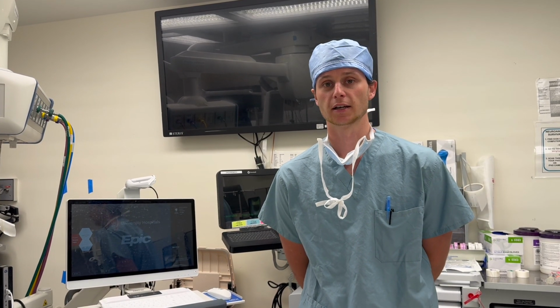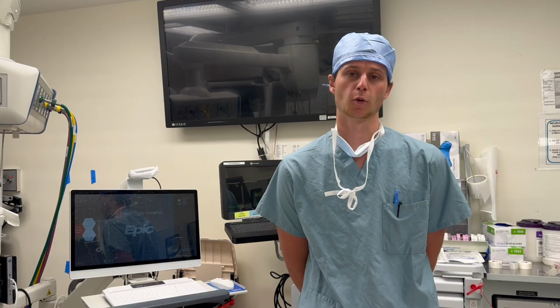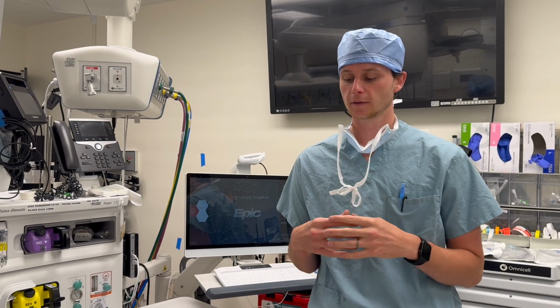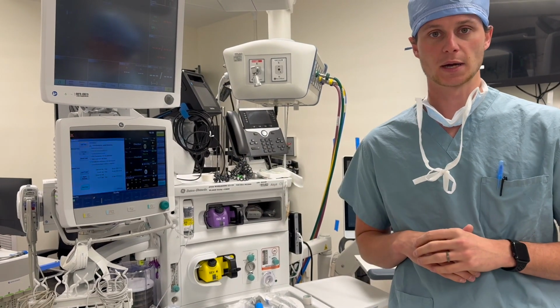Today we're going to be discussing how you can set up for an ENT case and different things to consider to make your rotation more successful. So for our ENT setup, we want to, for the most part, get ready with the same general case. We still want to follow our MS MAIDS, make sure our machine's ready to go, we have our suction available, and our monitors are all hooked up and ready to go.